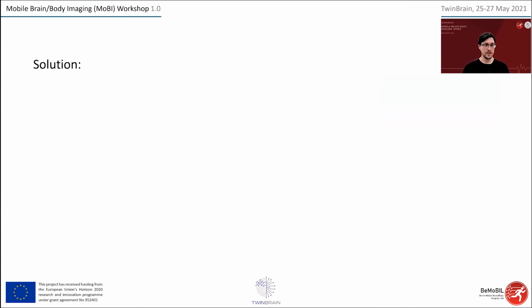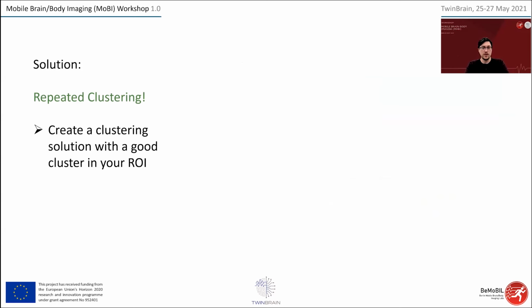So we have created a solution for this. And again, something repeated, in this case, repeated clustering. What's happening here is that we create a cluster solution, and this cluster solution should have a good cluster in a region of interest. So this is hopefully a stable solution in the end, which gives you also a good solution for your computation. I'm going to discuss what good means in this case.